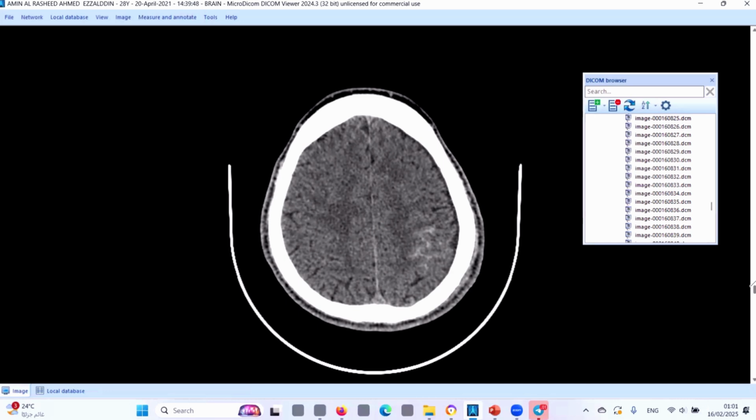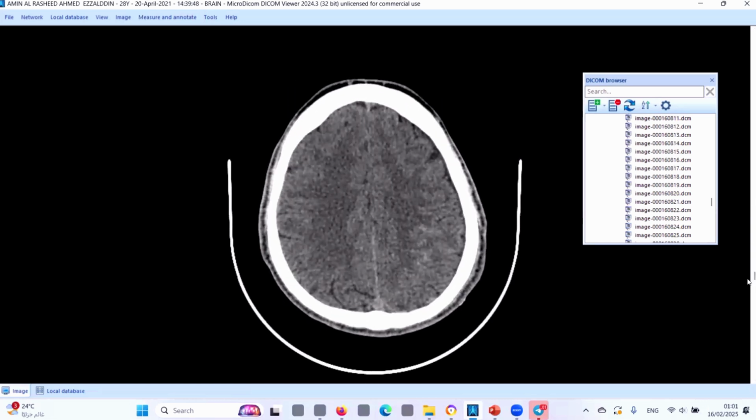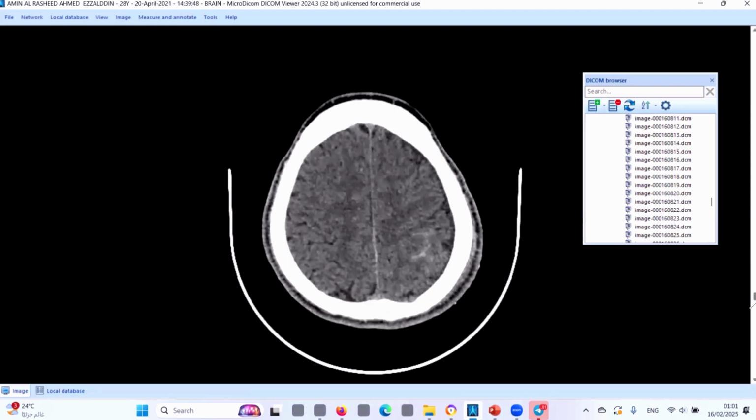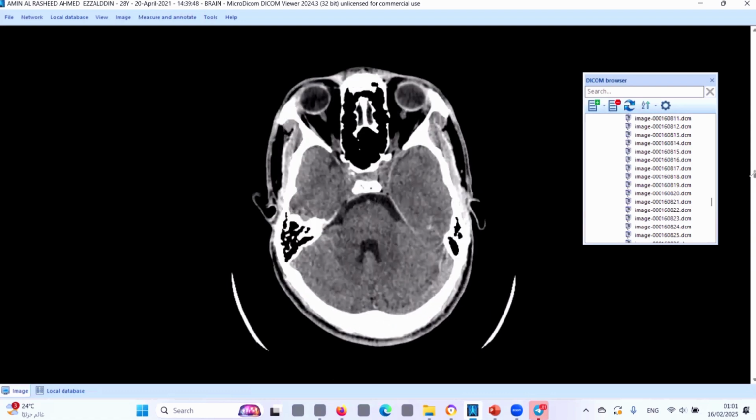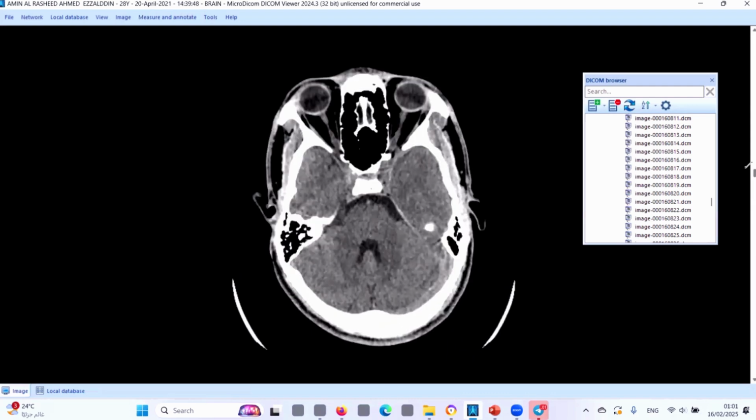This is the coup. Search for any contrecoup. Contrecoup can be present in the opposite direction, maybe here. So you should search at the right frontal region, sometimes at the right temporal region. We don't have any injury along the contrecoup side.